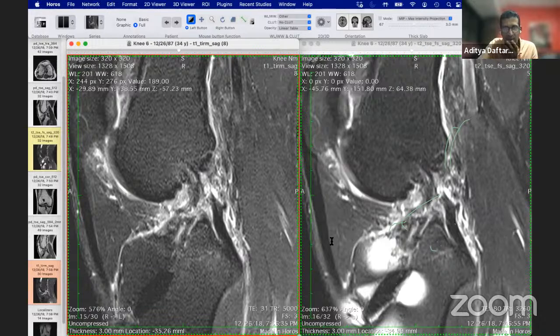In what cases should we recall? So proton deficient, no, these are what we call proton density images. And proton density images are something that we typically do in all cases, so any internal derangement case. If you were to talk about things very simply, if you have a case of internal derangement, you do proton density, T2 fat suppressed, and inversion recovery images. If you have a patient who has got a tumor or infection, then you're going to go with T1, T2, and T2 fat suppressed images.